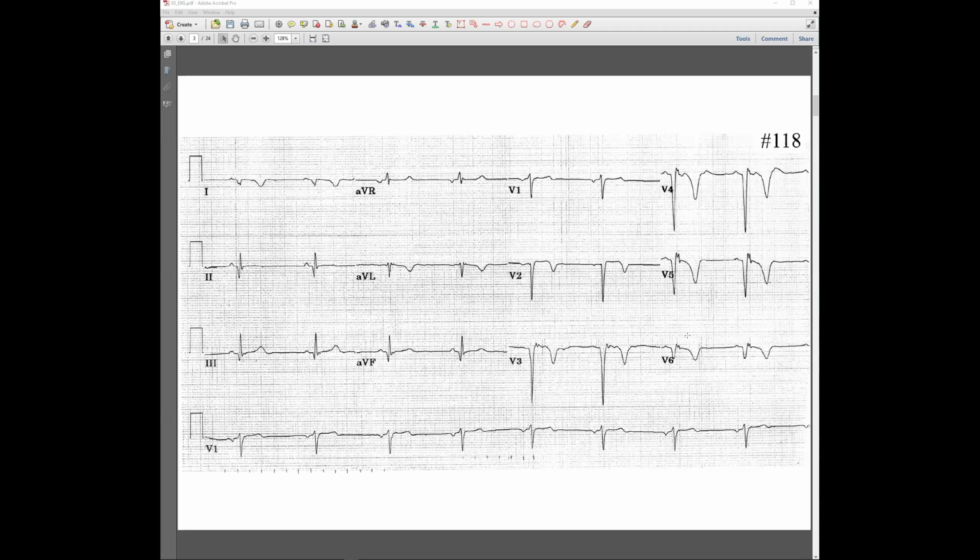Okay, so what I'm seeing is that it's rhythmic, and the heart rate was 50 beats per minute because I counted it at home. It was 6 squares, and I did 300 divided by 6, which was right, 50. Super. And I think it's bradycardia because it's 50.